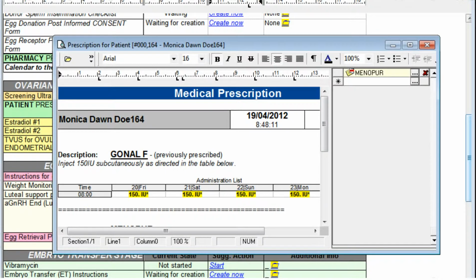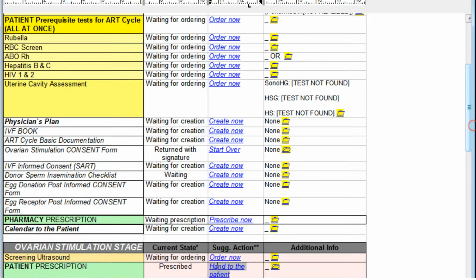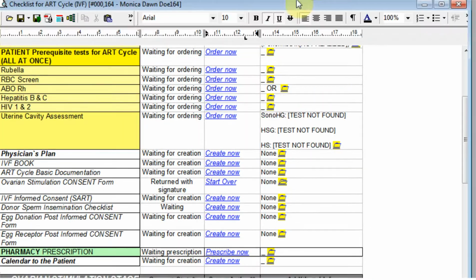The checkpoints are customizable, but the standard model brings you the checkpoints for semen assessment, tubal patency assessment, bringing data of all the tests that provide information about the state of the oviducts.